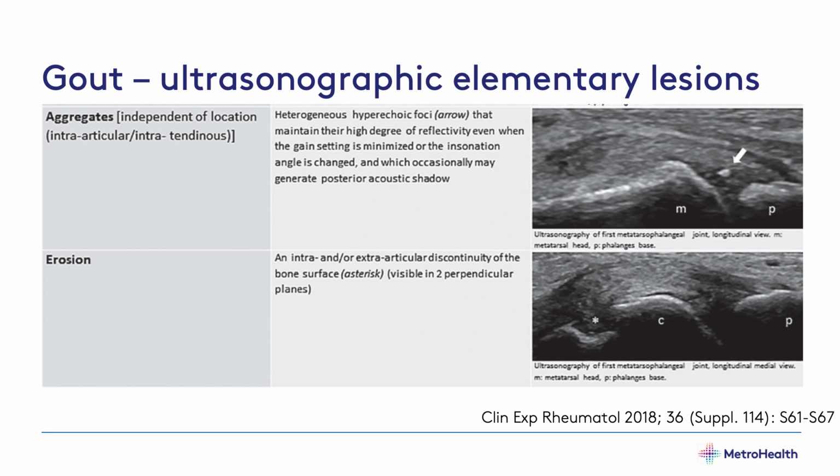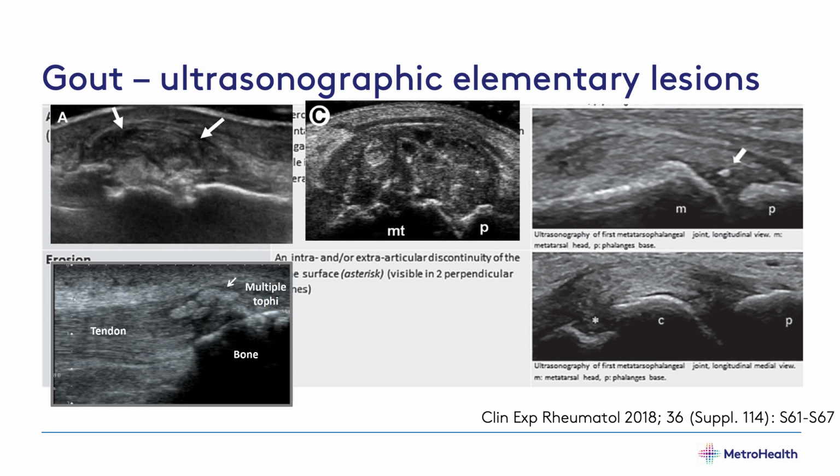And going back to the hyperechoic uric aggregate, I did not find this particular image that good, so here are some other images I've taken from the literature that to me are a little bit more convincing, and I'll have some to show you. But this one, which is labeled tophi, to me looks really good for hyperechoic uric aggregate. In fact, in school, they were telling us that they should look like a clump of wet sugar. Doesn't this look like a clump of wet sugar to you?